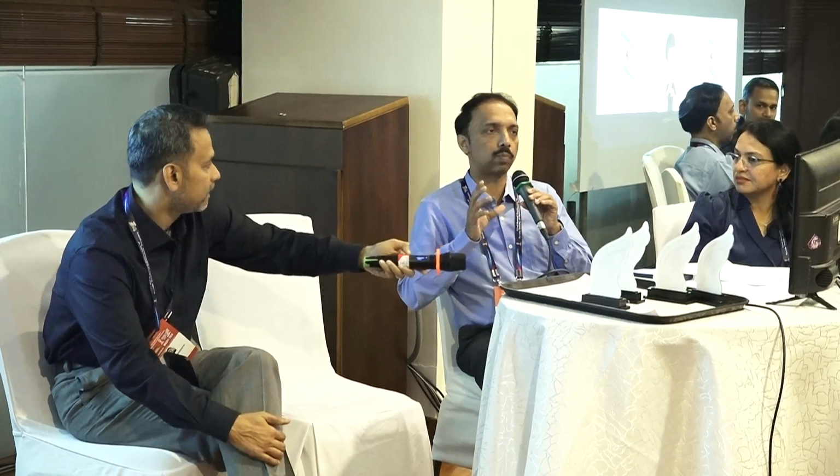Only one last comment is that the prominent middle layer sign is not seen in all CRAO patients. It should be seen, but it's more evident in the milder varieties because there is a contrast between this reflectivity and the adjacent reflectivity. Whereas in the severe ones, it's so opaque that you don't see it. So this is a good prognostic sign, because it tells you that you're dealing with a milder form of CRAO which is likely to resolve better.